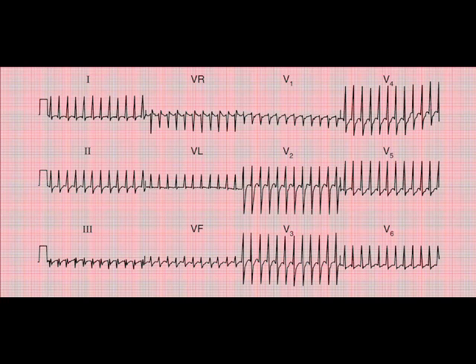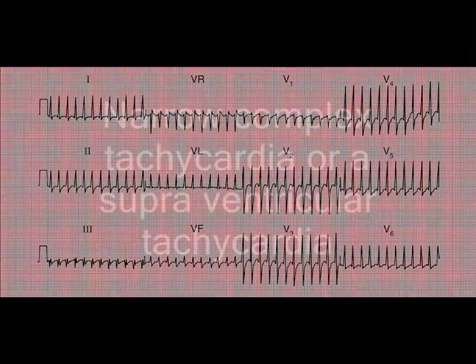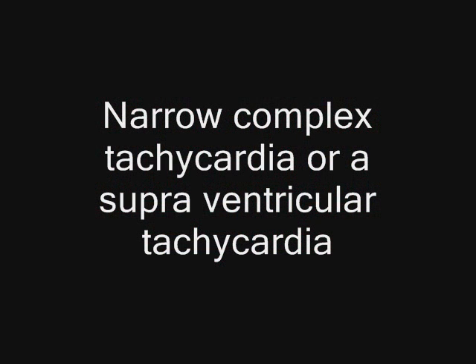What I would say is you need to assess the patient's hemodynamic status immediately by taking the blood pressure and other measurements, looking whether they're cold and clammy and so forth, because this needs to be treated promptly. This is an emergency. You can't have a patient with a heart rate this high and allow them not to be treated promptly. This will probably be by pharmacological method, could be by cardioversion, and then later on they'll need to be treated probably in a catheter lab. It is a narrow complex tachycardia. We cannot be certain it is sinus rhythm.